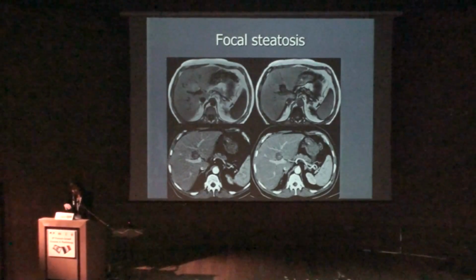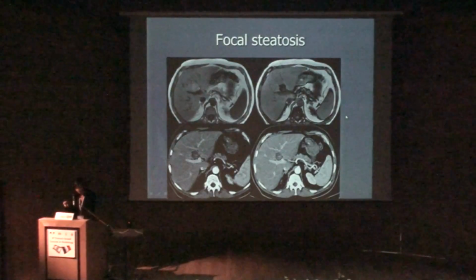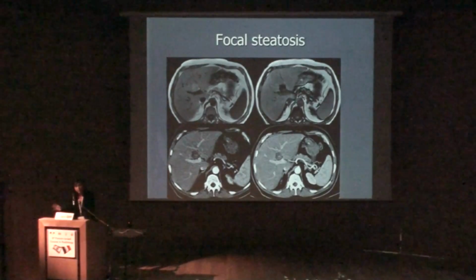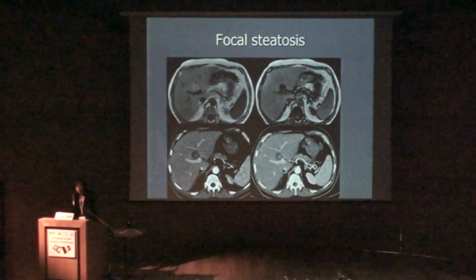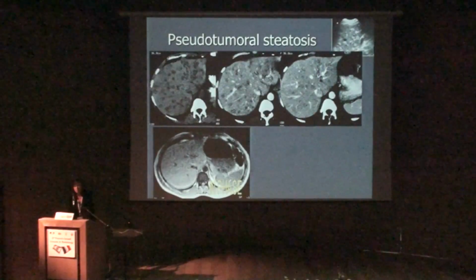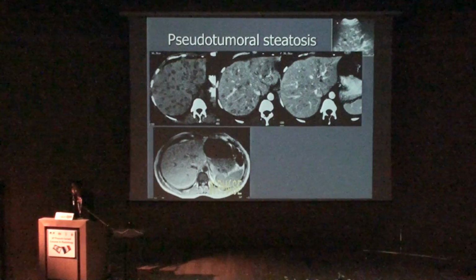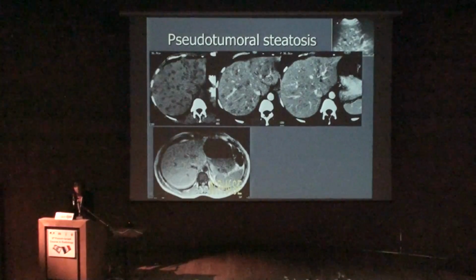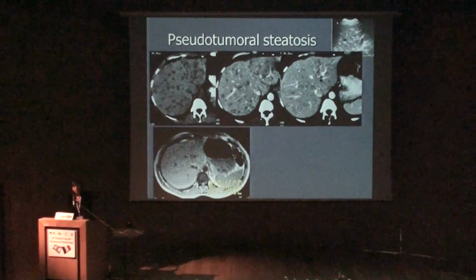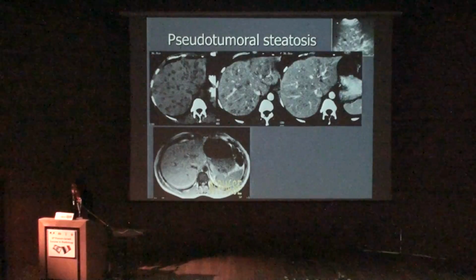So please remember that first location and then abnormal supply of portal venous tributaries might explain most of the uneven deposition of fat. However, there is still something that we do not understand: the mechanisms of pseudotumoral steatosis. These patients mimic multiple angiomas, steatotic hepatocellular adenomas, or even liver metastasis. You can see all these tiny, bright lesions in the liver.